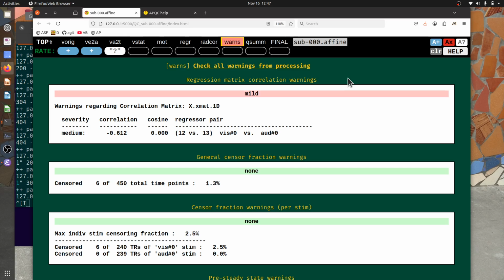And it can also draw from beginning and end data and compare, or whatever it needs to do, to check for warnings automatically. So all of these are things that we have found useful to check for, often for unfortunate reasons, because we realize that these problems occur in real data and we want to try to prevent them. So hopefully they pop up in pilot data rather than across all your subjects.